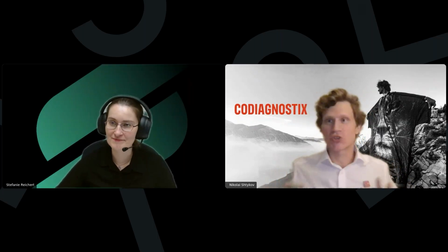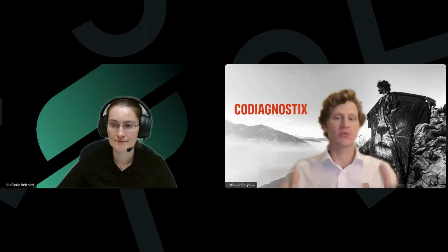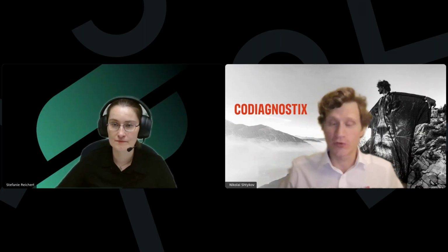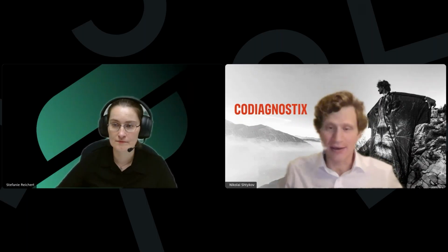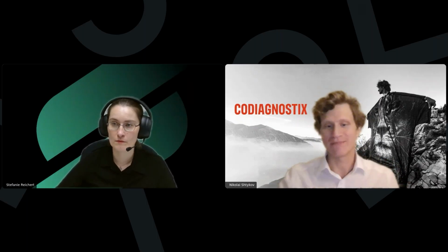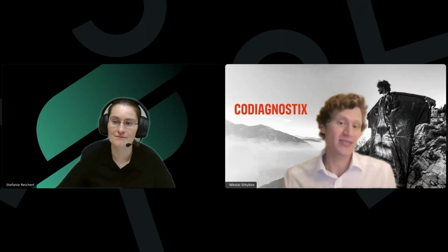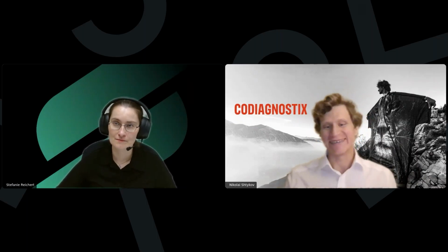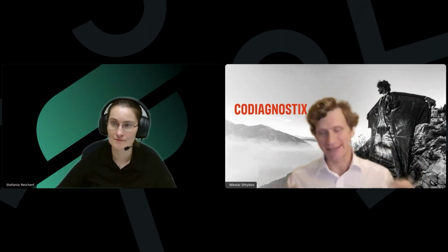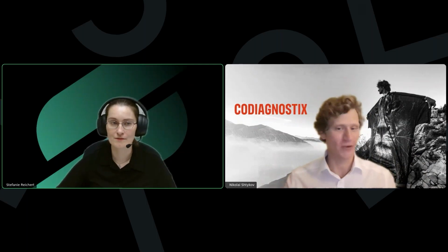Because I can show you a little bit more in this case, but as we announced, this lecture will be about the jaw filling function. And actually, I don't want to repeat, for example, the things I showed in the previous user meetings. But yes, we can do this, of course. But what we wanted to show is the new things. And the new thing is the jaw filling function.